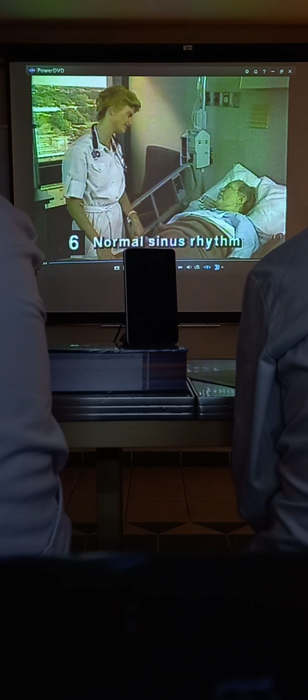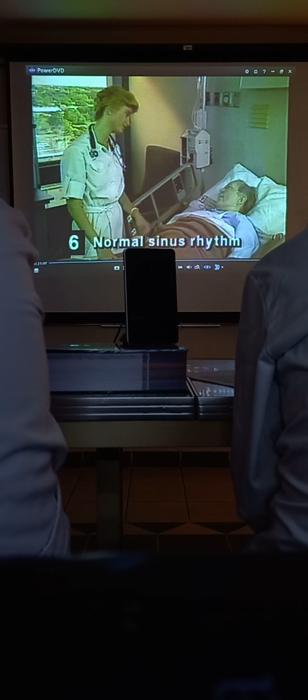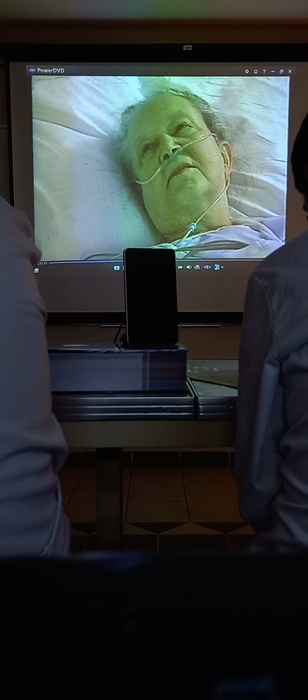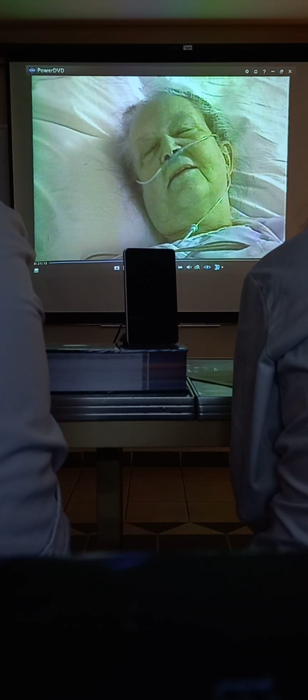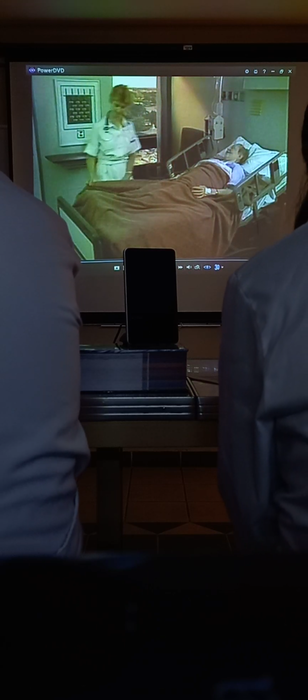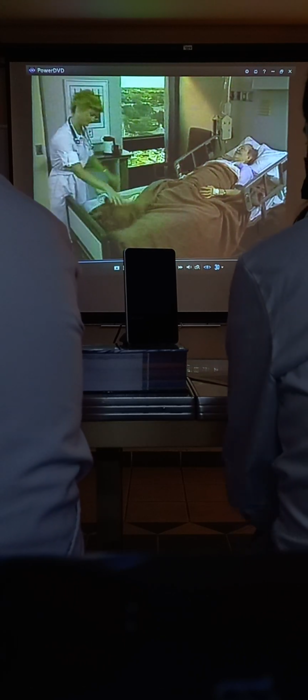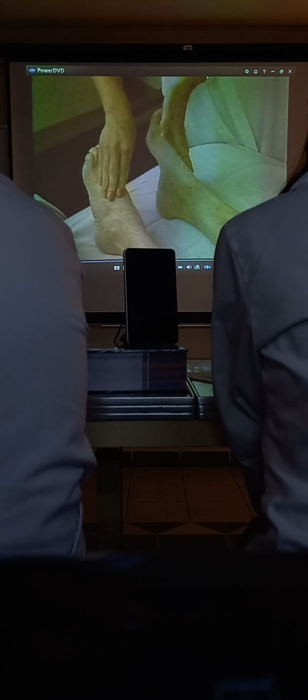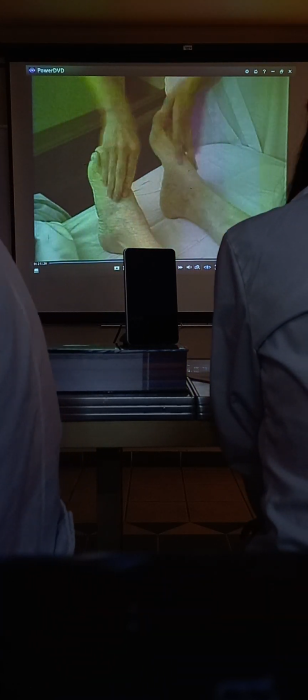This patient is a female, age 73. She was admitted 36 hours ago with congestive heart failure and has been receiving Digitalis 0.25 milligram daily and Lasix 40 milligrams twice a day since she was admitted. Her condition has been improving. She's breathing better and her lungs are less congested. Part of your assessment is to evaluate her EKG.